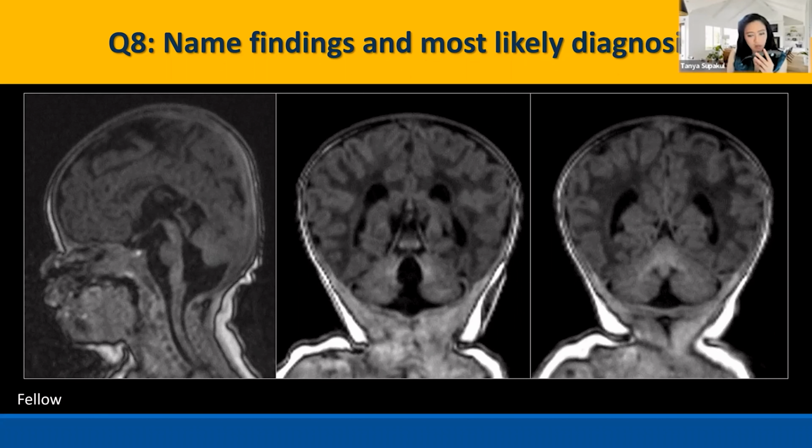Blake pouch cyst usually causes obstruction, right? So you're right, yes, hydrocephalus. But you mentioned something about the pons. Do you think the pons is normal? It is very hypoplastic. Okay, a hypoplastic pons, right? And some cystic changes here, an upward fastigium, and hypoplasia of the vermis.